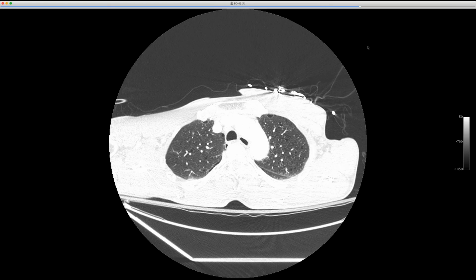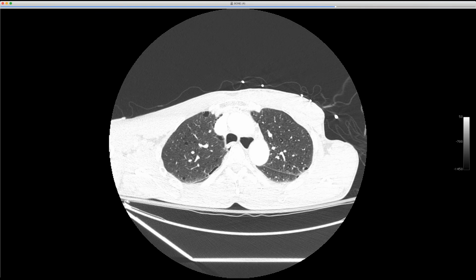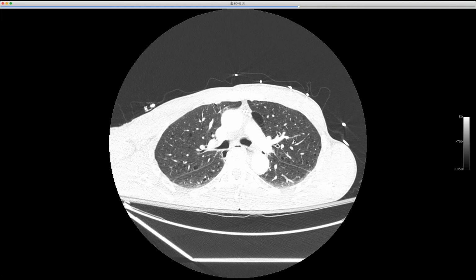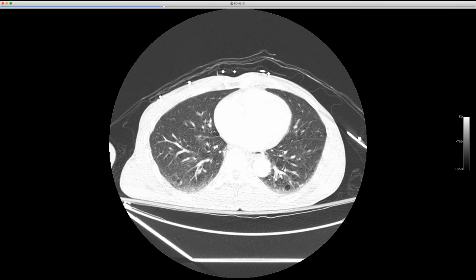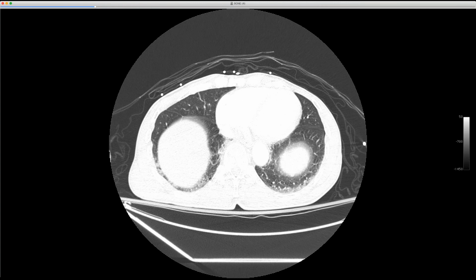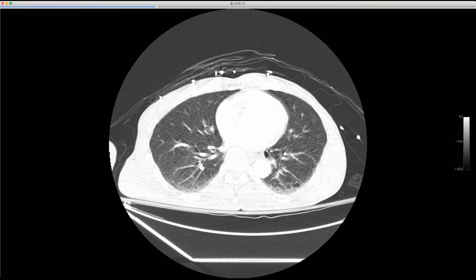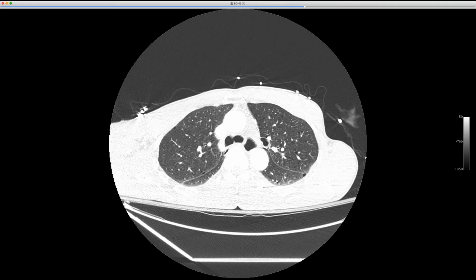patient here. And, interesting, I was asked about this case, and there's these cysts, and there's emphysema. So I think this was just an incidental LCH in a trauma patient. Interesting, the cysts go down pretty low, but I think when you get very down to the bottom, they sort of just fade out. You might be able to find one or two, but would you guys think that, and the patient was a smoker, would you query anything other than LCH?